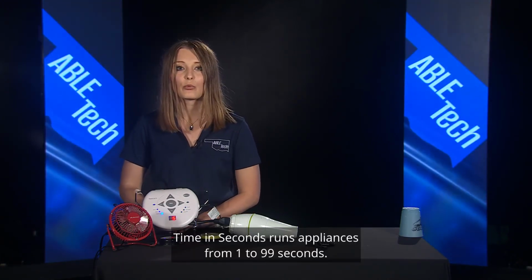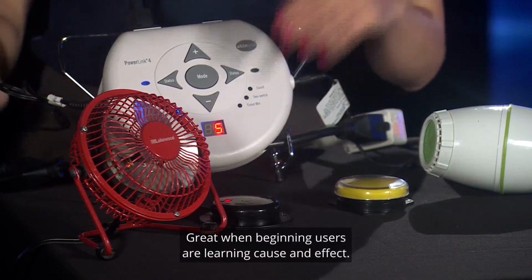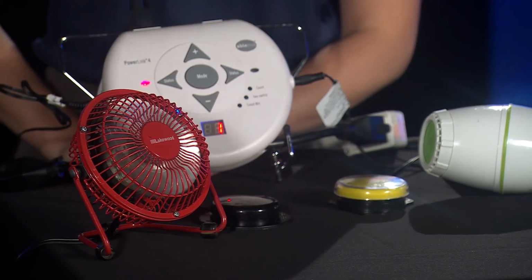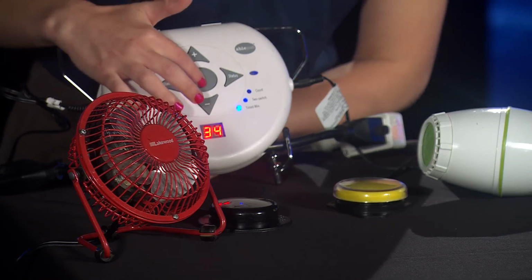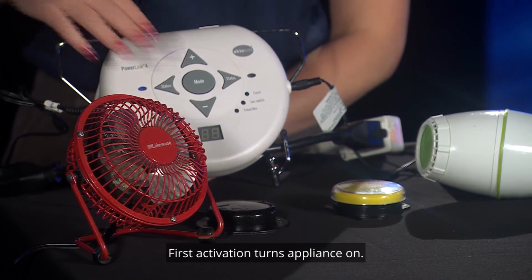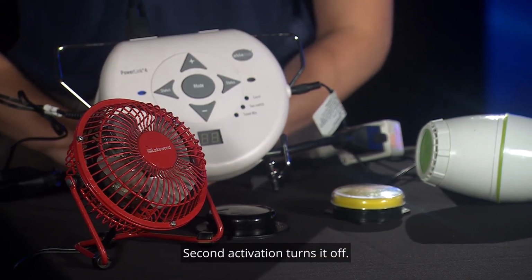Time in seconds. Runs appliances from 1 to 99 seconds. Great when beginning users are learning cause and effect. Timed minutes runs appliances from 1 to 99 minutes, about 1.5 hours. Latch. First activation turns appliance on. Second activation turns it off.